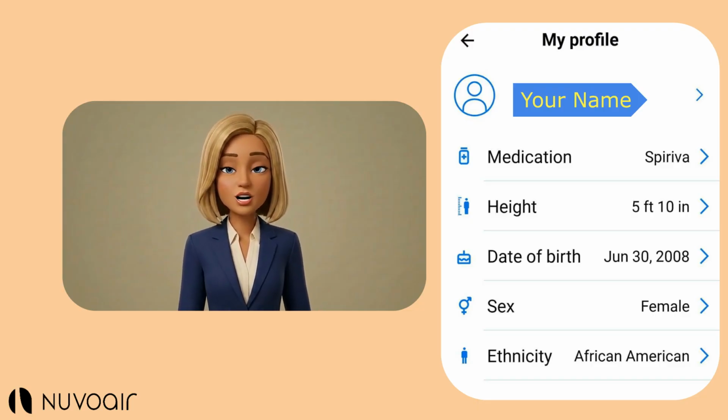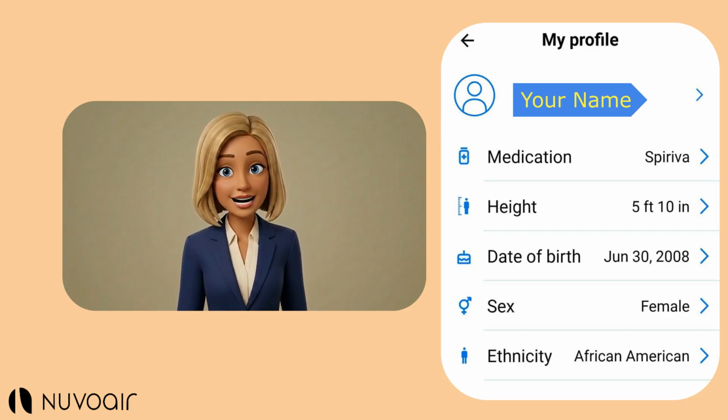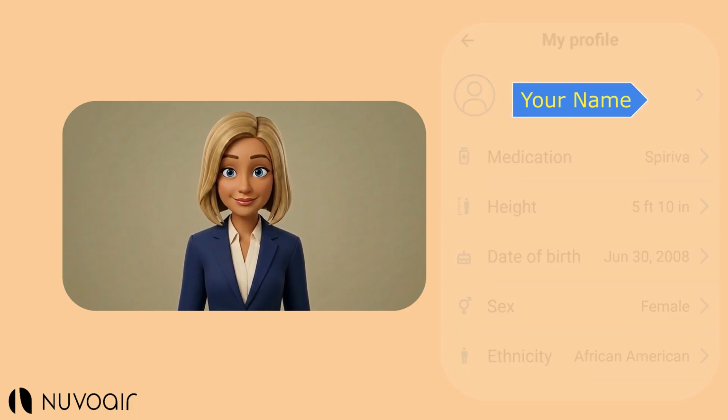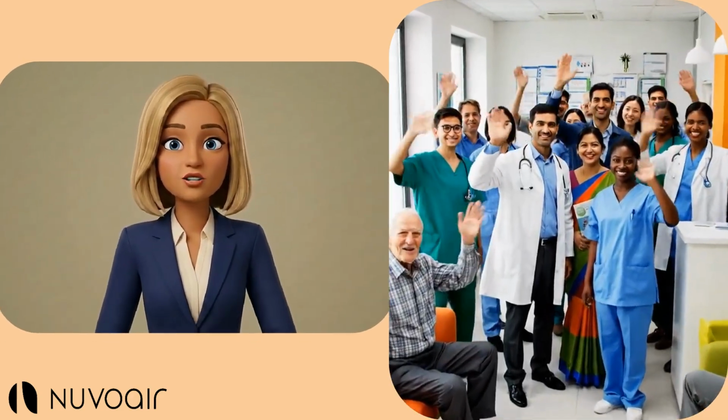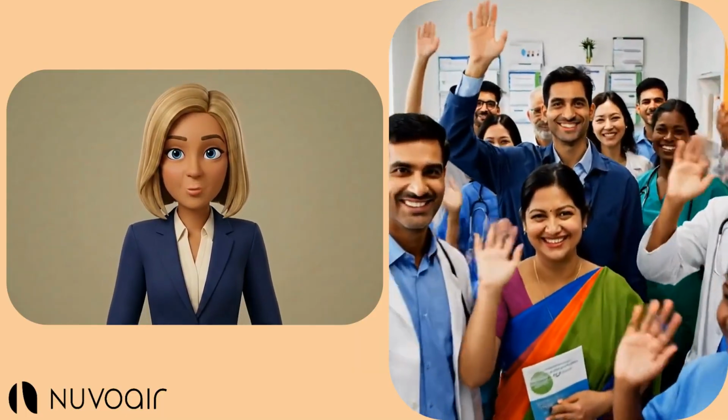Look at you. You are ready to start your spirometry testing. I look forward to seeing your tests and receiving your questionnaires. Thank you so much for spending some time with us. It was fun getting to know you while you get to learn the app.